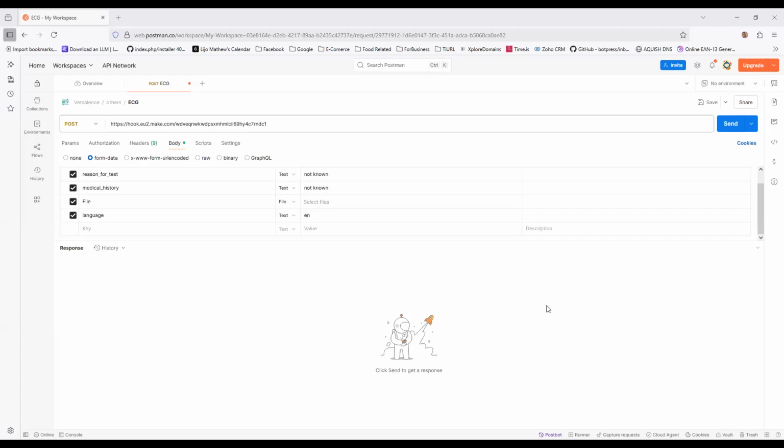Hi, what I'm going to show you is how using AI automation, we can scan images and get data extracted out of it and also find meaningful analysis. In this demo, I'm going to take it a step further and show you ECG analysis from a file, an image or a file that contains the ECG, and we'll generate a report of that ECG, which gives a more meaningful insight about what that ECG is and other things. So you will just get to see that in a minute.